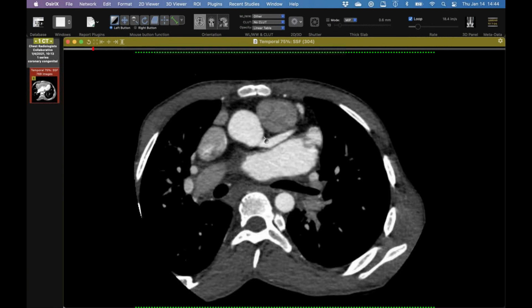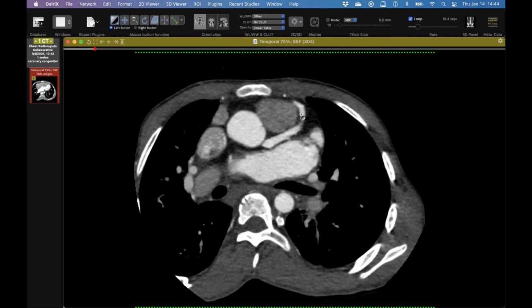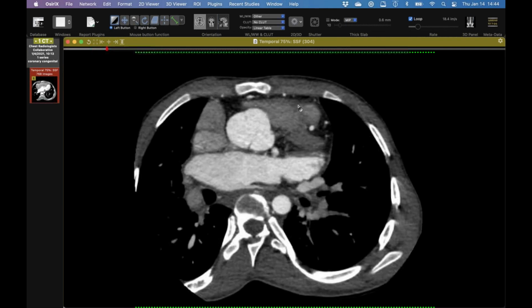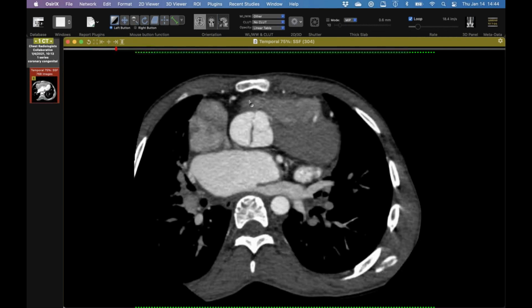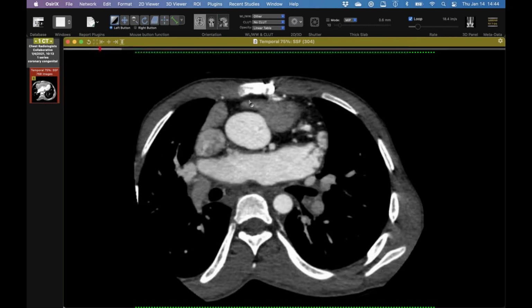So just an innocuous variant, but one worth knowing about if you were going to do, say, surgery, you were going to cross clamp the aorta. And I mean, they always do a cath typically, but they are doing, of course, CT in some younger risk patients. Or if the cardiologist was going to go do a cath, they'd probably want to know the coronaries in advance if possible, but this isn't going to cause any trouble in and of itself.